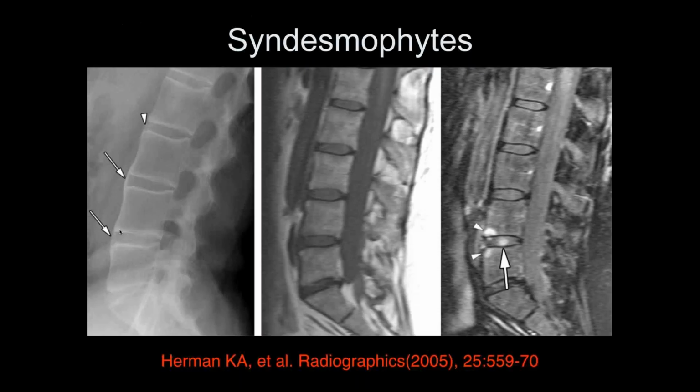Dr. Bruce, how do you differentiate syndesmophyte from ossification of the anterior longitudinal ligament on that plain film? Syndesmophytes are ossification of the anterior longitudinal ligament. That's what a syndesmophyte is. That's how it's different from an osteophyte. Okay. So isn't it protrusion of the eroded corners and extension of the bone marrow? Then eventually, if you have long-standing disease, you can actually get marrow extending into this.